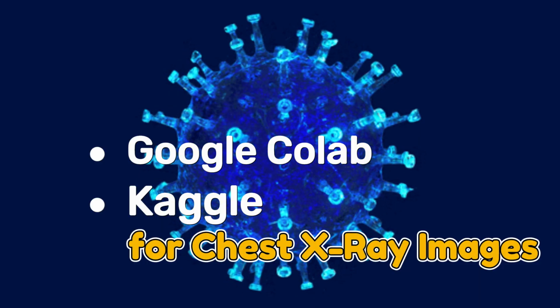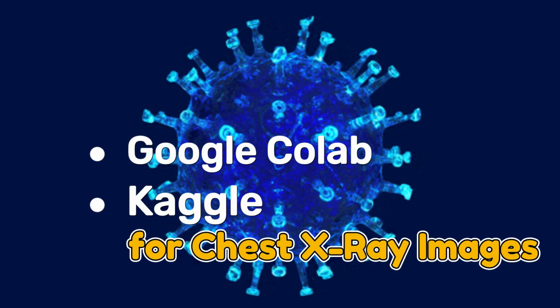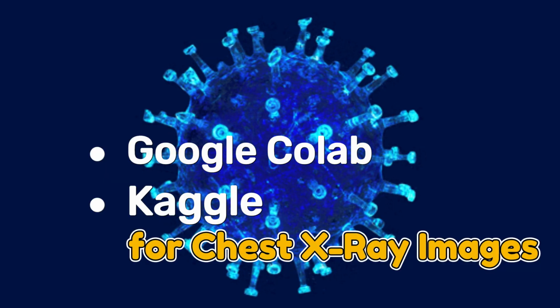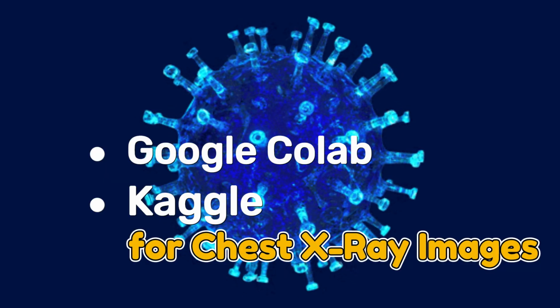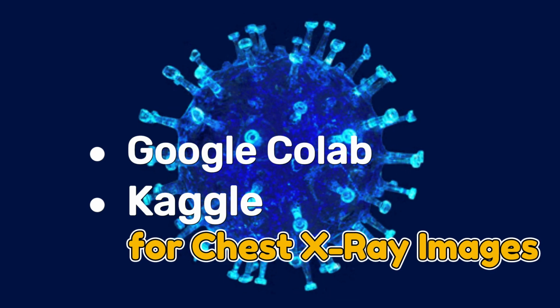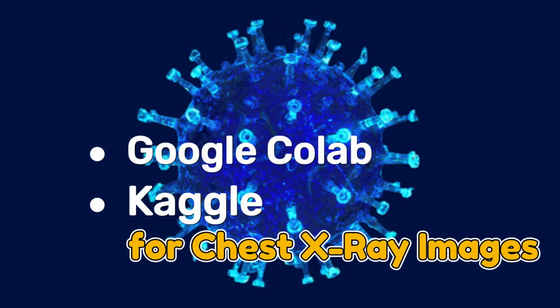You can of course use your local machine for running this application as well, but it will require some space and some patience, because if you don't have GPUs specifically, then it will take a lot of time to train the models that we are going to use today.